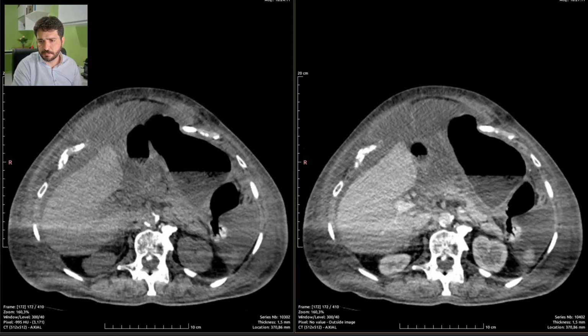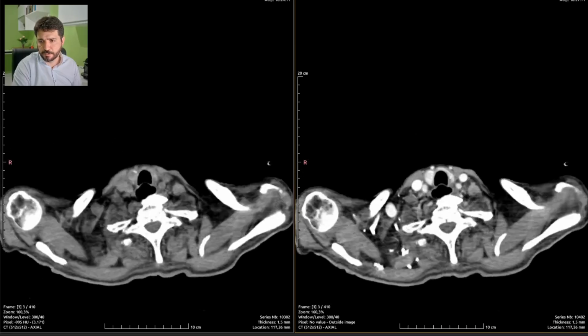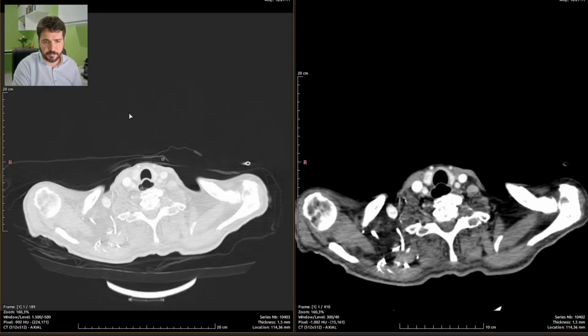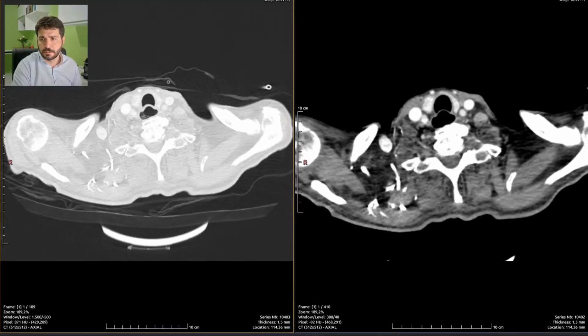Here, contrast enhancement. The patient has one arm over her chest. This is a very poorly done exam of the worst kind, so it's contrast enhanced. Let's just type that in so we don't forget it.